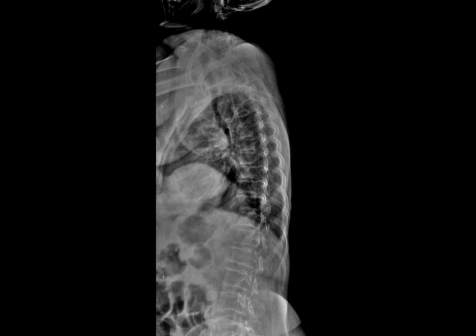So do you see anything? Of course, AP and lateral, by the way. A little bit of degenerative changes in the spine. Okay, degenerative changes, some osteopenia. Yes, there is this paravertebral. There is something not proper here. Yes. Try to see it on the other projection.